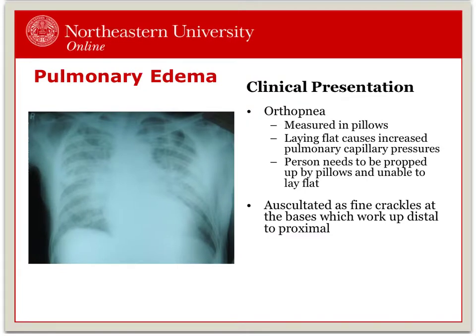Pulmonary edema is a result of blood backflow and increased capillary pressure in the lungs. The most common cause of pulmonary edema is left heart failure. These image findings demonstrate patchy infiltrates as noted on the radiograph. The severity is determined by the superior progression of these infiltrates. Note there is very little room for the air in these lungs in the upper portions.